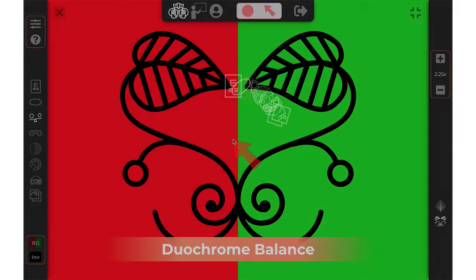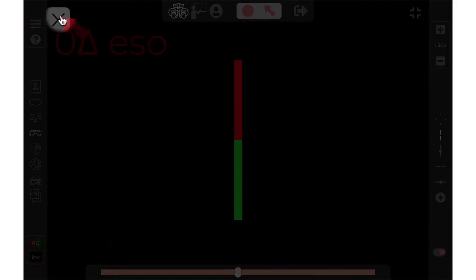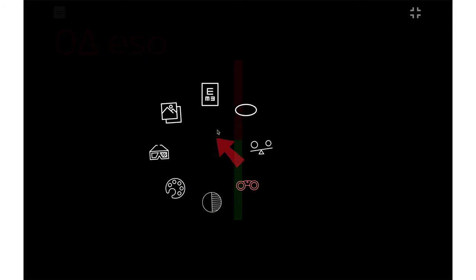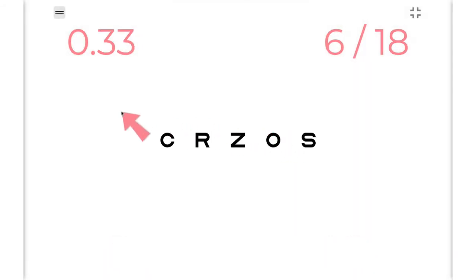You can also then hide your sidebars by clicking on the X in the top left-hand side corner to have a nice, clear, distraction-free interface for your patient. And they'll still pop out when you move your cursor to the edges of the screen. So it's super simple to work with a mouse.